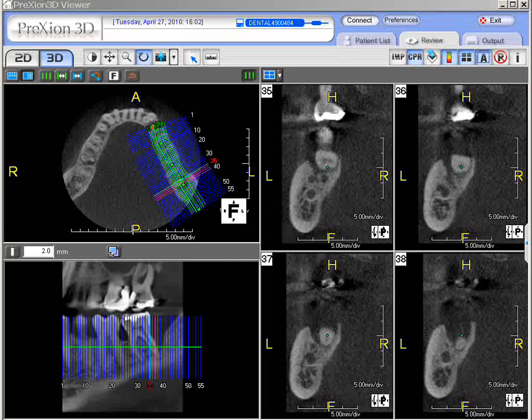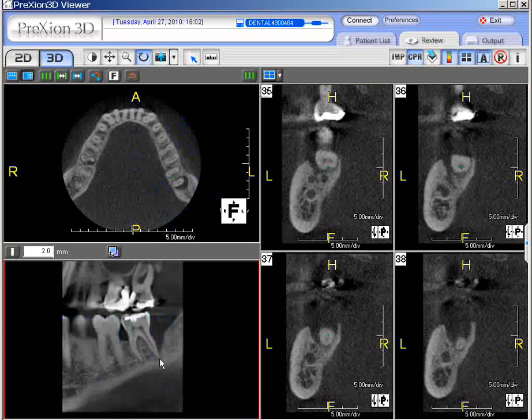This topic will cover scenes, that is, how to create, save, and recall a scene that is created from manipulating the software. Here, we drew a half-side CPR function over a particular area of concern. In this case, if we take our visible cross-section line off, we see a little bit of a perio defect here. Looks like on number 18.